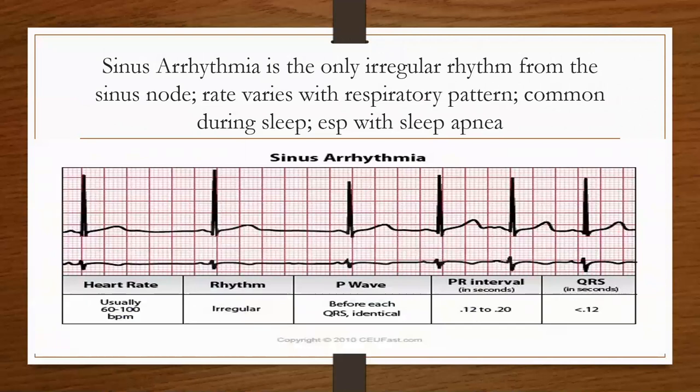So a sinus arrhythmia is the only irregular rhythm from the sinus node, okay? The rate varies with the respiratory pattern, and sinus arrhythmias are common during sleep, especially with patients that suffer from sleep apnea.